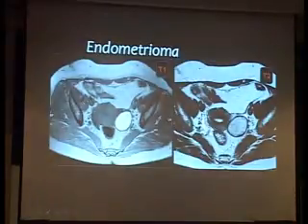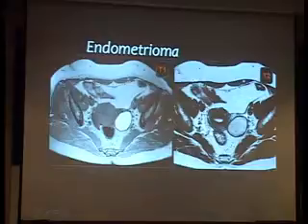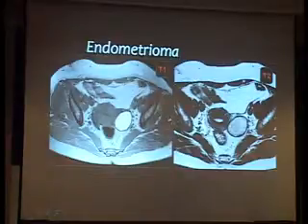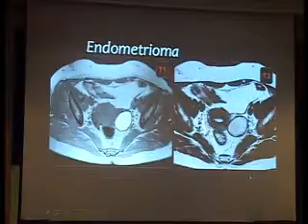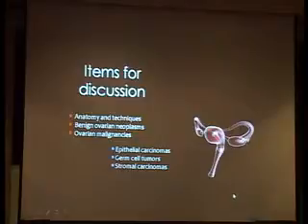But look for this cyst which is bright in the T1 but less bright in the T2 weighted image, and this is an endometrioma, and this finding is known as the shading sign. A hemorrhage in the endometrioma will not persist of high signal in the T2 weighted images. It will show somewhat decrease in its signal intensity in the T2 weighted images, and of course if you have this fat suppression, it will not be suppressed.